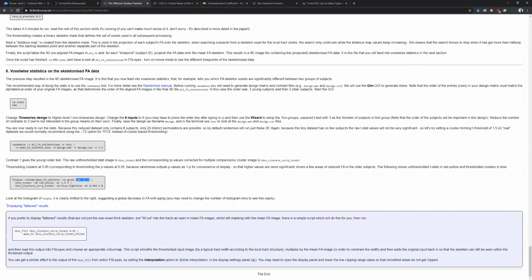And so it's truncating the value, meaning it's not that it's only showing values between 0.3 and 0.7. It's only going to have the range of the color vary between 0.3 and 0.7.